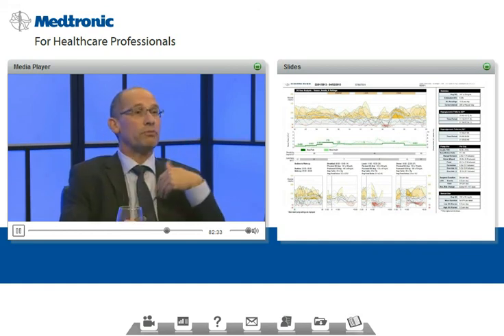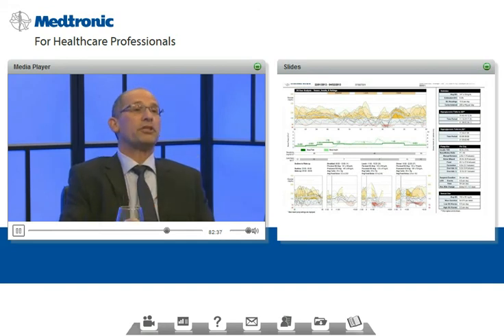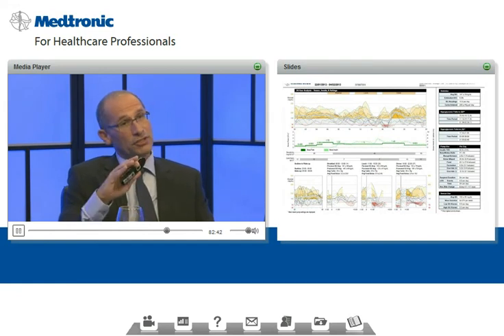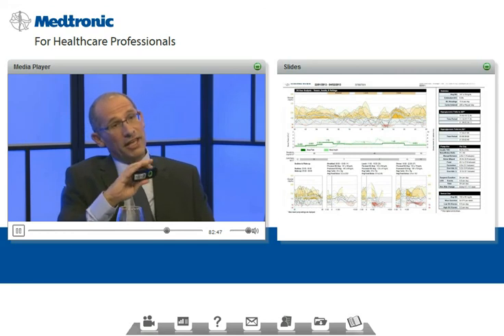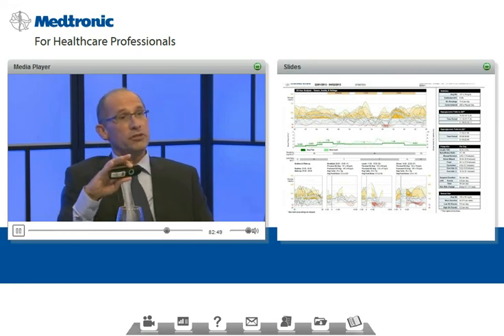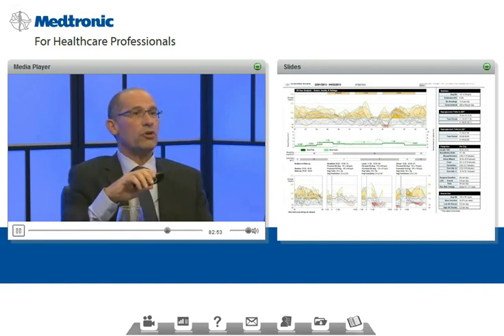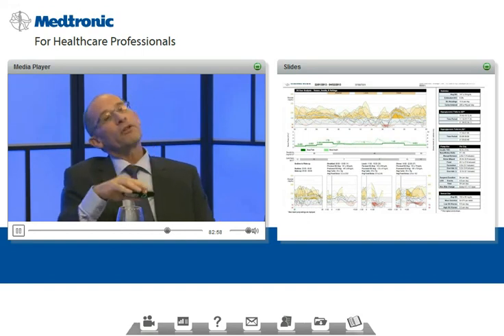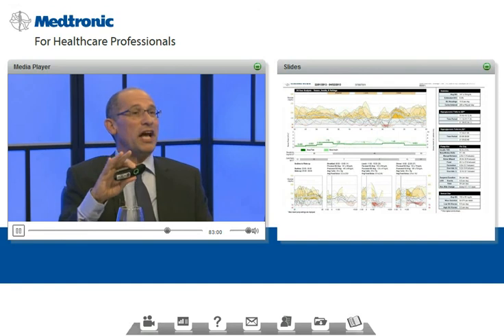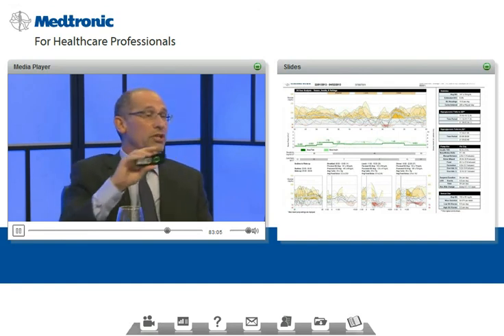We have additional reports, and in the presentation of the dashboard, we can see on the top square a green line which is continuous, and this represents the basal insulin, while you have another green line which is dotted, and this gives you a notion of the active insulin at those day-to-day changes during the 2 weeks that the patient was downloading.